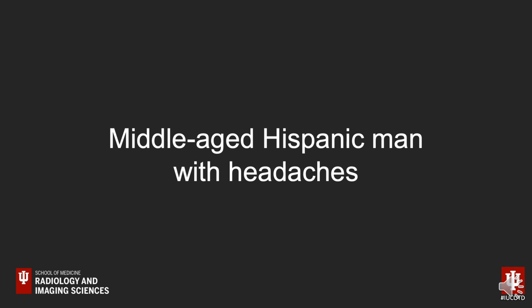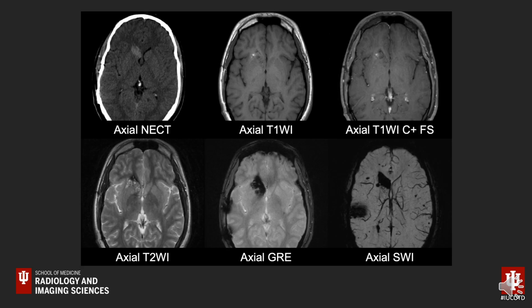So this is our case this week. It's a patient who is a middle-aged Hispanic man who presented with headaches. I've got 6 images for you to take a look at.